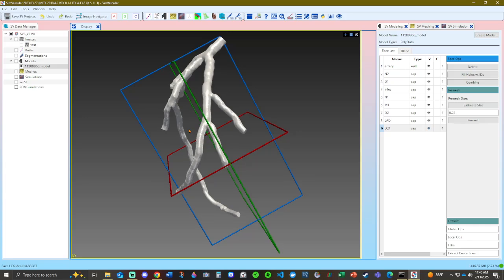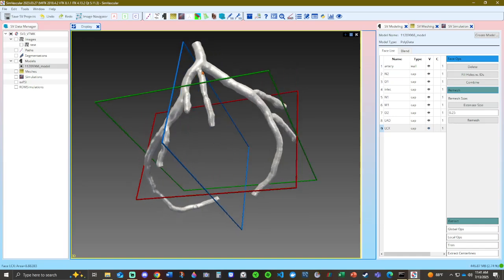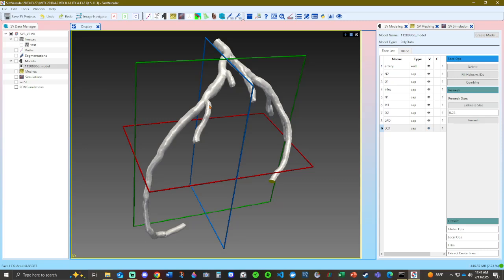So that's just the naming convention. Here we have 1, 2, and then 3. And then this one is a bit weird, so I just chose to call it 1 because I didn't want to have a 3 that's way up here. But that's how you do it.